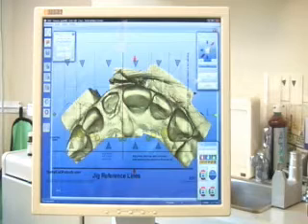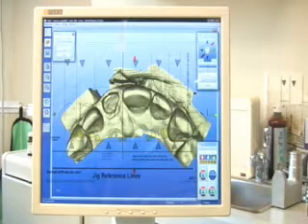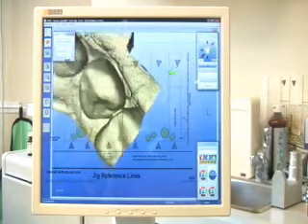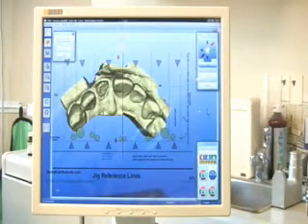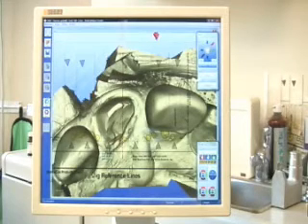When designing the second restoration, the first step will be determining the center of the virtual model. This step is important since when we are manipulating a virtual model by depressing the left trackball button and rotating the trackball, it rotates around a center point. This center point is determined at this step. It is important to pick a common center point when designing all the restorations. It will ease the manipulation of the virtual model and allow for easier placement of the overlay.